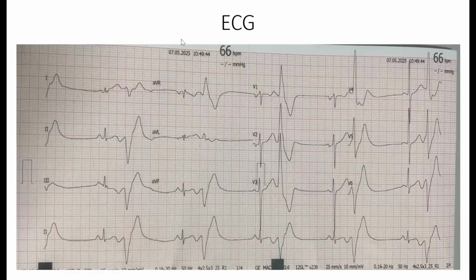Because you have echocardiographic criteria, and the Doppler sign is consistent with the patient history. This patient is at risk of sudden death. Okay, young female, mitral valve prolapse, annular disjunction, and you have the Pickelhaube sign on echo, with disjunction of approximately 10 millimeters. That's way too big. The cutoff is about 5 millimeters for risk of sudden death. Most investigators agree. Therefore, PVC elimination may improve the symptomatic functionality of the patient.